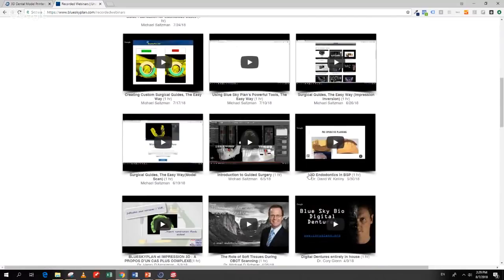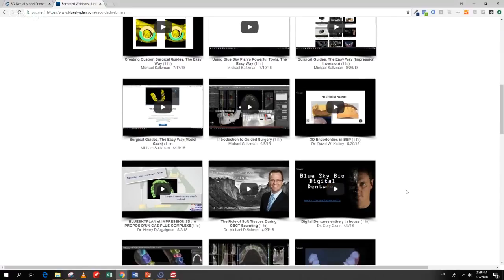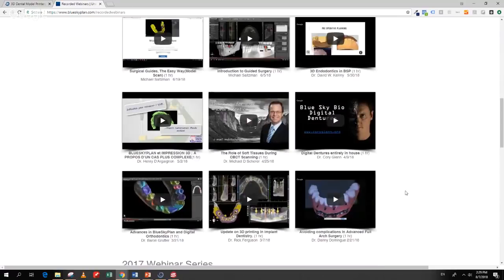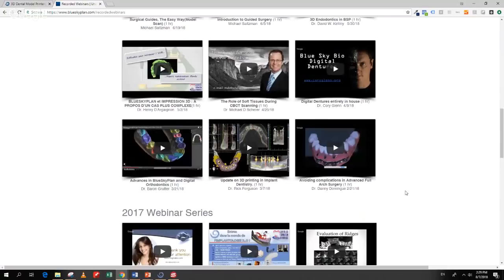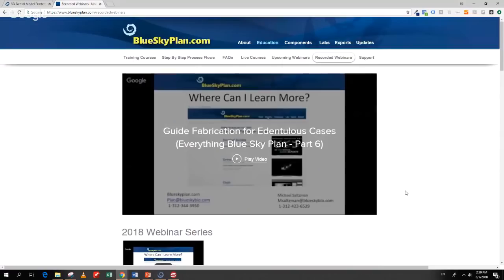And the point of this current webinar series of Everything Blue Sky Plan is to show the step-by-step processes that are discussed in a lot of other more clinically focused presentations. So we have fantastic speakers that have given many different presentations on many different topics in the first half of 2018, also in previous years as well. And the webinar series I'm giving now, again, is to take a lot of those topics that were discussed and show this step-by-step in the Blue Sky Plan software. We have more additional software releases planned for this year, so we'll be announcing them and the new features and functionalities as they come out.